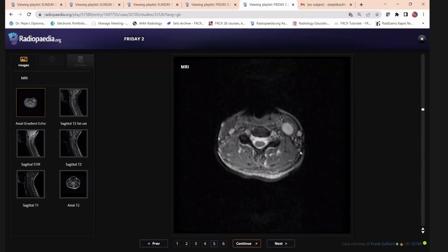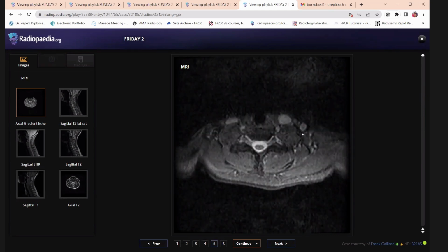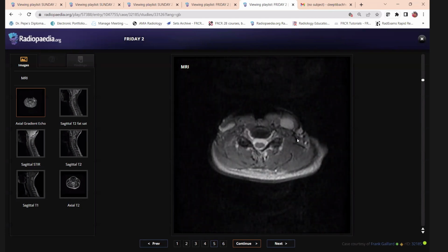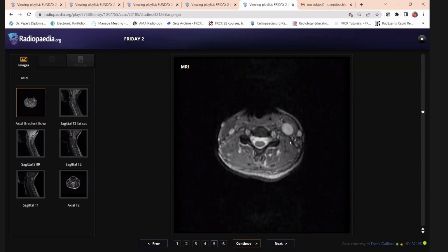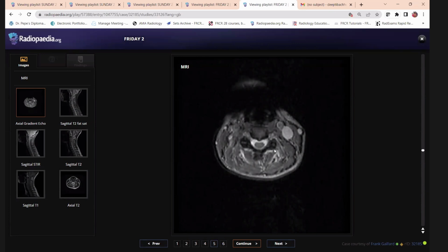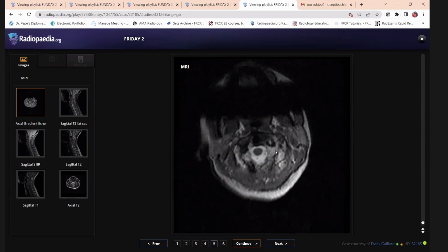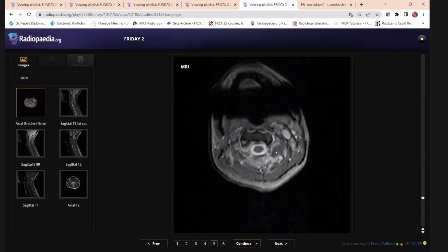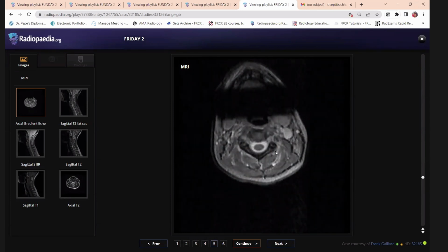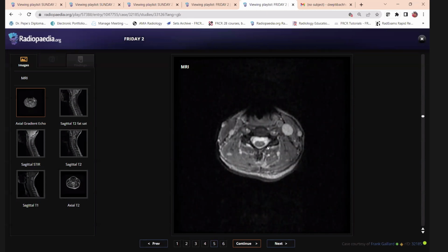This is axial MRI images, gradient echo of the same patient. I'll start from the upper sections. I'm looking for any evidence of displacement or injury within the spinal cord, and also for any blooming artifact within the spinal canal that suggests internal hemorrhage, intra or extradural. I can't see any areas of blooming artifact. There is a bulge seen at the posterior aspect of the C2 vertebral body, indenting the CSF space. However, it is not abutting the cord.